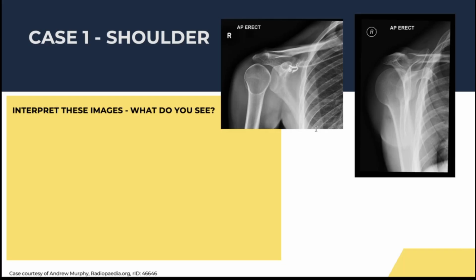The chat off to my side and I can see Joanna is typing. A light bulb sign. You would be very correct, Joanna. That is indeed a light bulb sign.